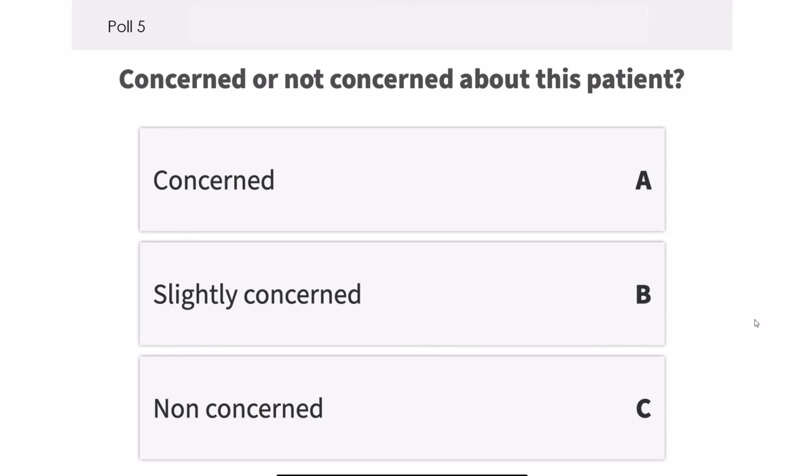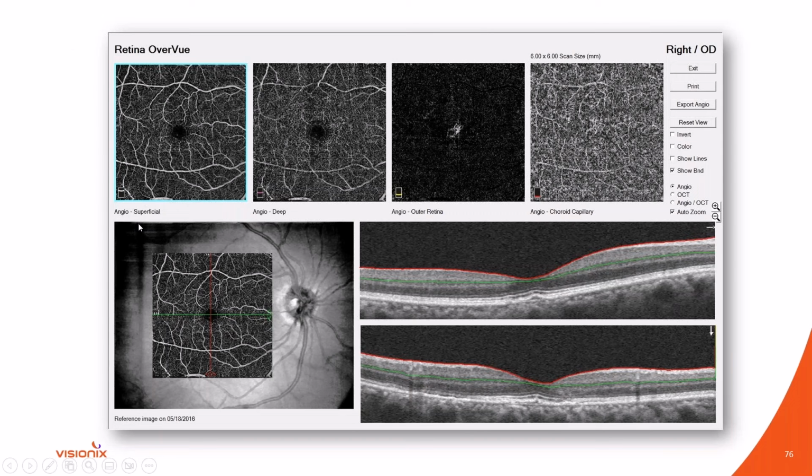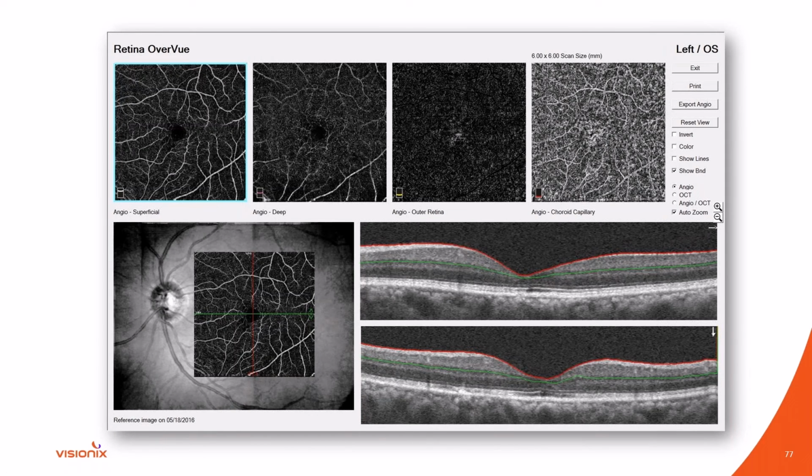This is the beauty of having OCT angiography. And you take a look in this particular case. This was the OCT angiogram in the right eye. And note, again, with macular degeneration, I'm focusing my attention on these two on the right, and we can pick up the presence of a small choroidal neovascular membrane at this level and at this level. It has not leaked fluid yet at this point. Actually, the left eye, which was the 20/40 eye, is that a subtle little change right there? Hard to see, right in the center there.